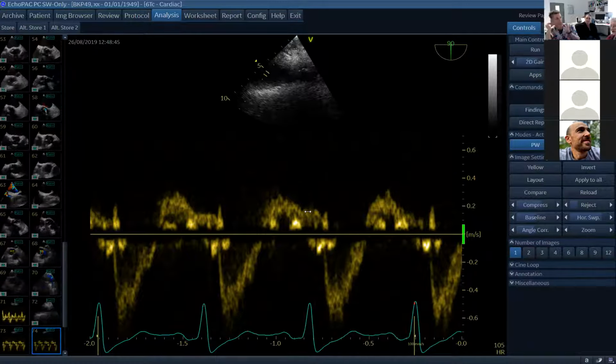This needs clinical correlation with results of blood cultures, and maybe you would have done more views of the actual function of the prosthesis to see if it's dehisced, and you would have done specific views looking for abscesses or perforation of the tissue valve leaflets. Nice. Is any of this going to get better with antibiotics and supportive therapy, which you can provide in the ICU? Not if it's dehisced. Fantastic, they need referral to a cardiothoracic surgeon.